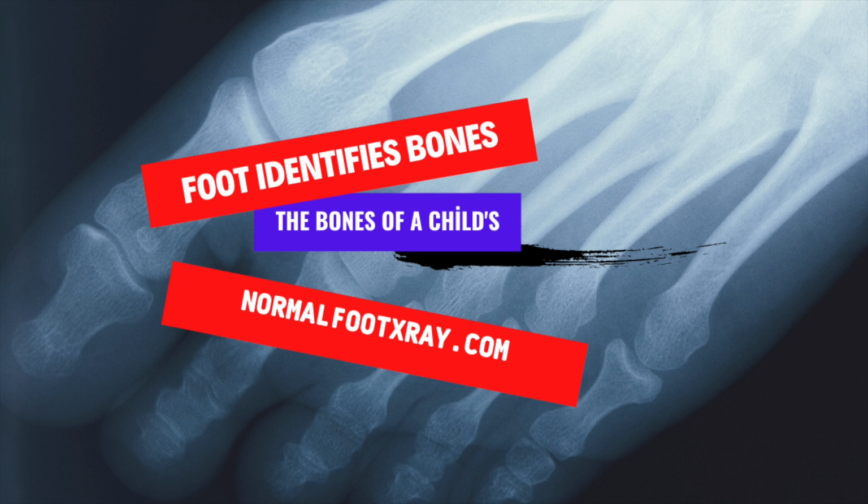Similarly, an anteroposterior X-ray of the foot is helpful in determining arthritis. It is also useful to find out what type of trauma the patient has suffered. If the pain has spread to the bones, the X-ray can help in determining the cause. A foot X-ray is a basic diagnostic tool for orthopedic conditions. Normal foot X-ray. It helps doctors determine the cause of common symptoms.